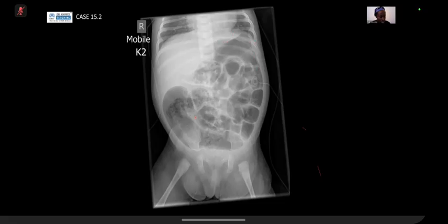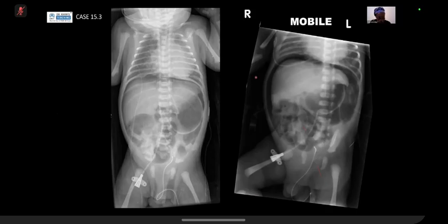Like, so you can see here, you can see bowel wall around and here, but there's nothing around this bit. So this tells you that this is pneumoperitoneum. And then finally on this case, this shows a continuous diaphragm sign. So if we look very closely at the diaphragm, it looks like you can see the entirety of the diaphragm, even across the midline, which we don't normally see.